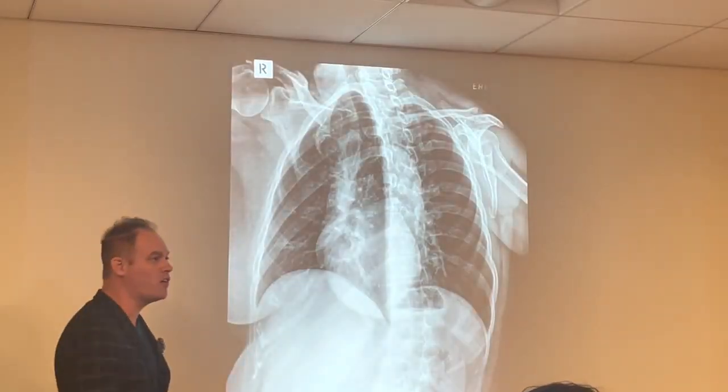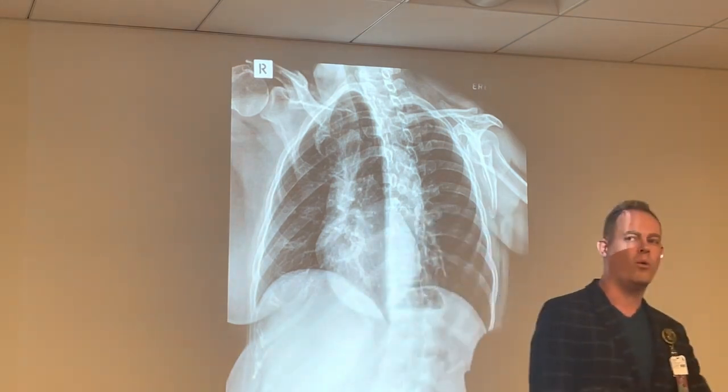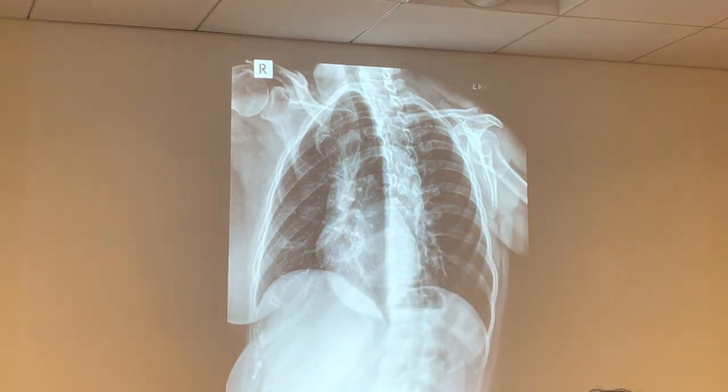All right, guys, let's look at this first image. We have an oblique ribs X-ray. What specific oblique is this and why? Well, the clavicles are lower, so you said yesterday the clavicles are lower. I hear the right answer, but I want to make sure we all know it. RAO? No. The LAO. The right side, because the right side is up.